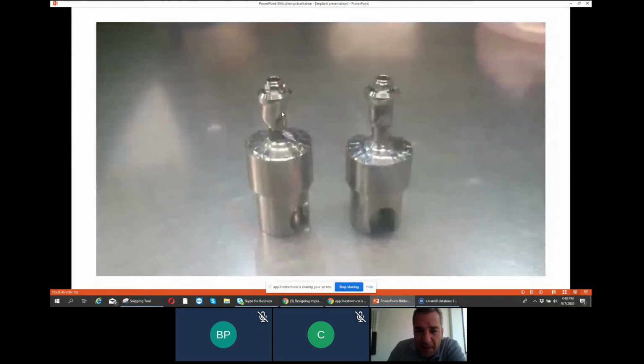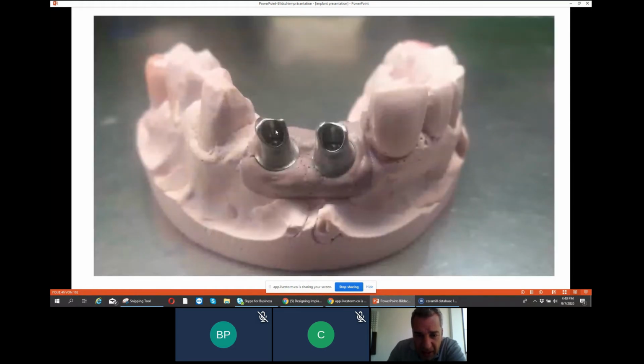Don't make it in one step, abutment plus crown. Make the abutment first and then scan it, because here we need to cut the titanium and finish the surface. Like here, we cut it and finalize it. Then we will close here with wax and spray it, and then start designing as it is a normal crown for the final restoration.